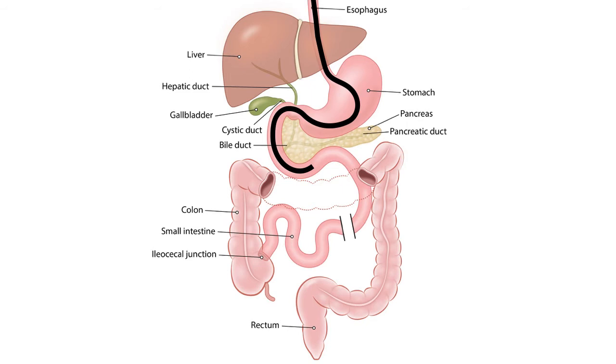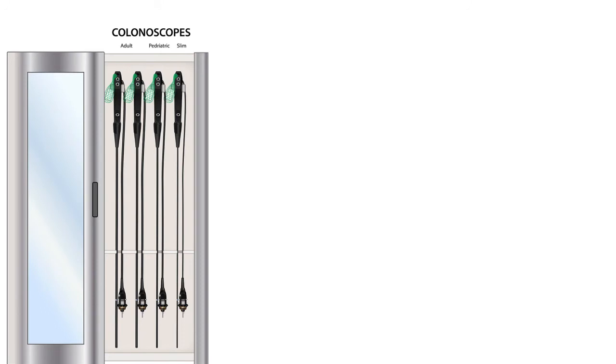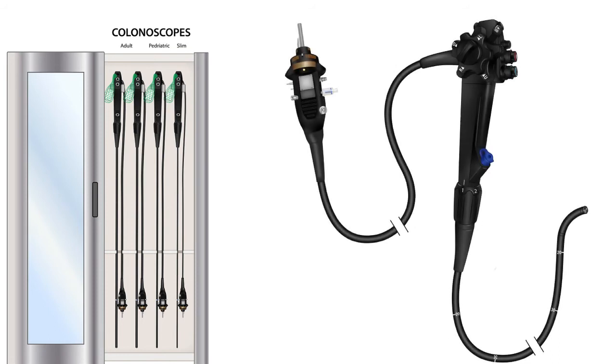So, let us look at what a colonoscopy does. So, here is a colonoscope. It is a little bit longer than a gastroscope and it has a variable stiffness function that we will talk about later.